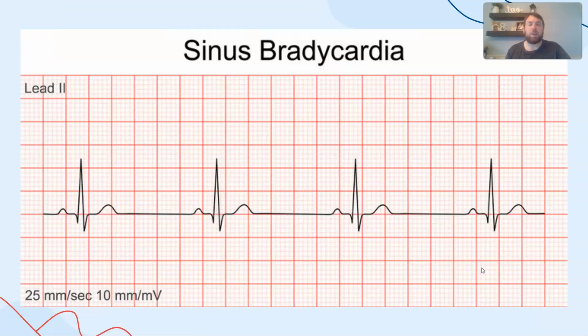This individual is experiencing bradycardia, which is noted as less than 60 beats per minute. You can see that the spacing between the T wave and the P wave is much too long. If we count the big squares again, let's see, the beginning of this one is a little bit after there and a little bit to there. So it's like 1, 2, 3, almost 4 different big squares. That's almost 4/5 or 0.8 of a second.